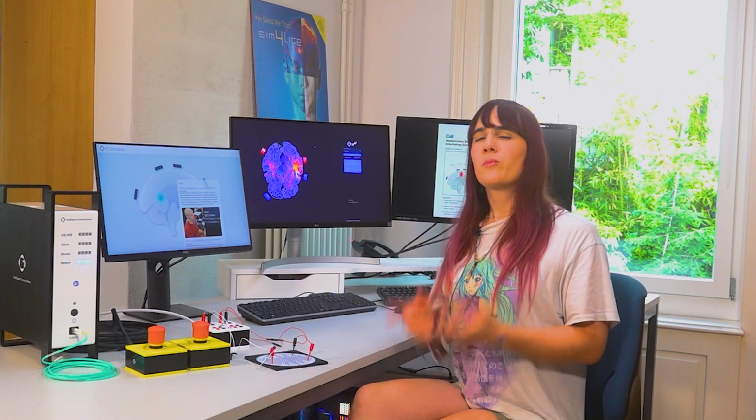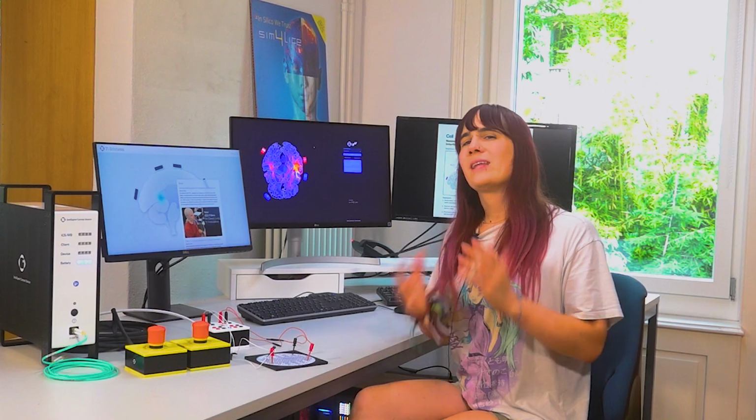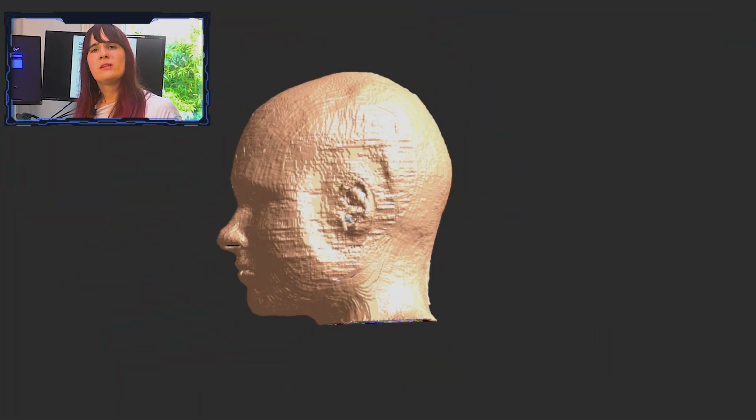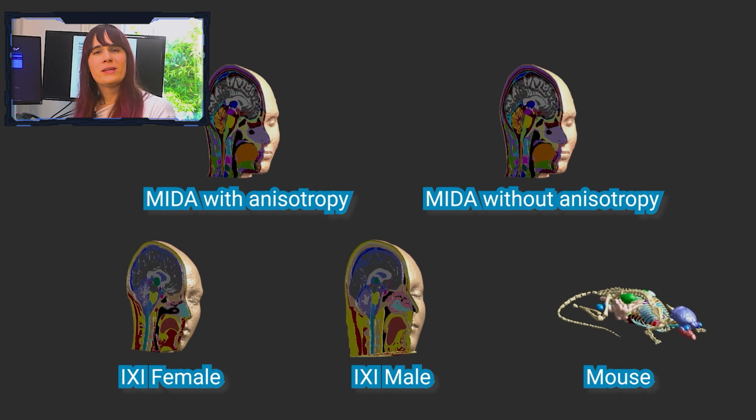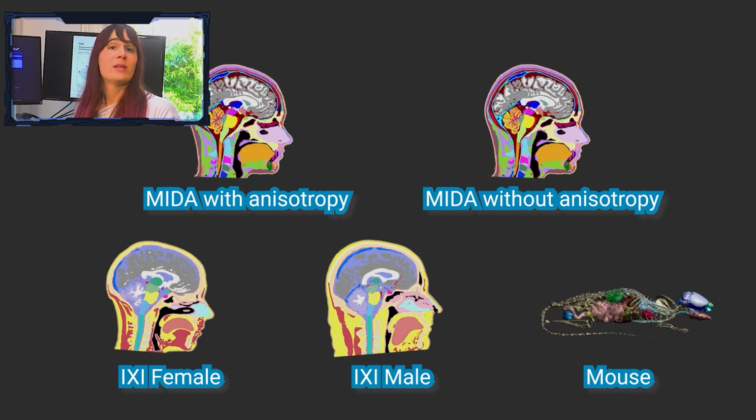Plugging into scalable computational resources was also a precondition for personalized stimulation modeling to bring temporal interference planning to the next level. While we continue to offer a range of pre-computed, state-of-the-art human and animal models for population variability assessments, with TIP 3.0, users can upload their own anatomical data for personalized TI stimulation assessment, planning, and optimization.